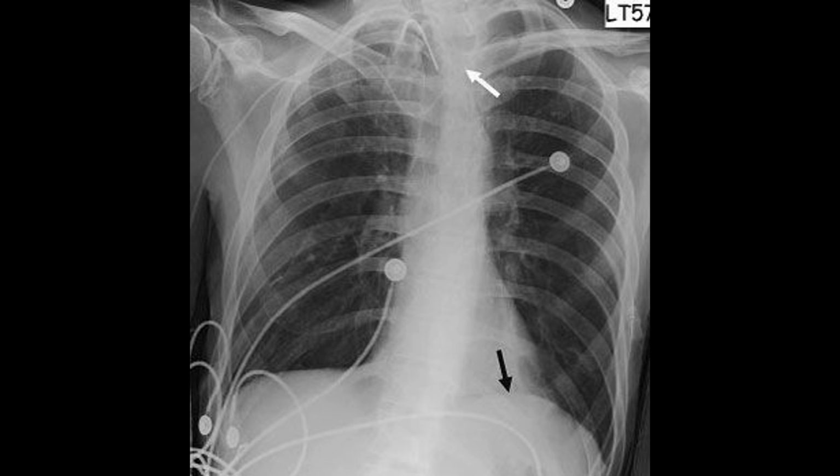Because the left upper lobe remains aerated, the left heart border is preserved, but the cardiac silhouette may appear straighter than usual. This has been described as the flat waist sign. Volume loss leads to leftward rotation of the heart, making the frontal projection mimic a right anterior oblique appearance.